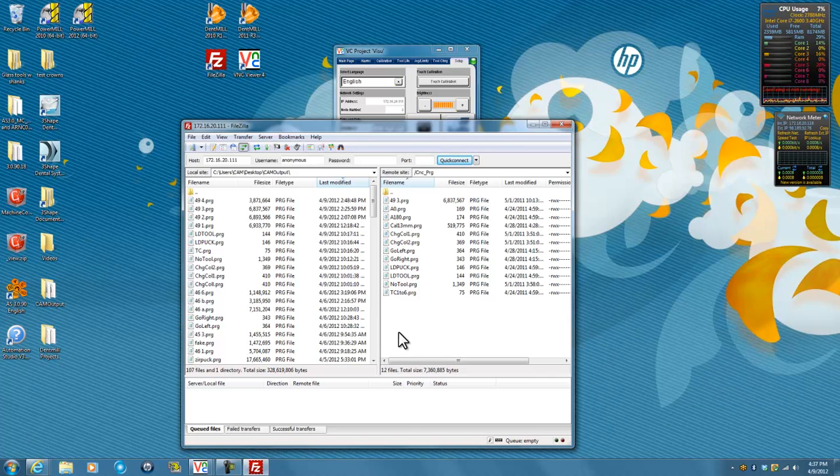So for example, if I want to run the last program we generated on our DentalMill CAM milling program, I'll come over here, I'll highlight 49-4 and just drag it over to the CNC milling machine. You can see that it's moving it over the network and loading it onto our milling machine, and here it is, 49-4. So now we're able to run it if we go to the milling machine.